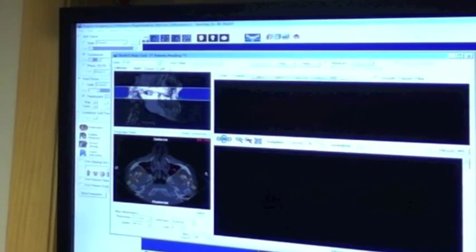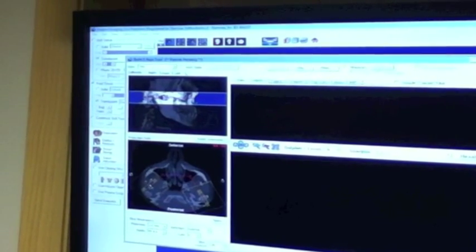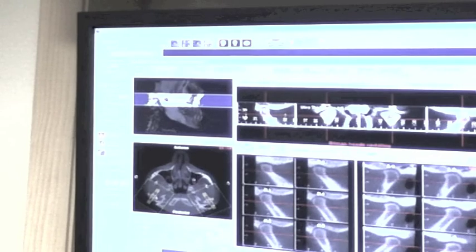Then you'll move to the bottom of the screen and move the bottom red point into the center of the condyle. You can also use your mouse to click on the top red points if you need to adjust it to bisect differently. And once that's adjusted, hit apply.